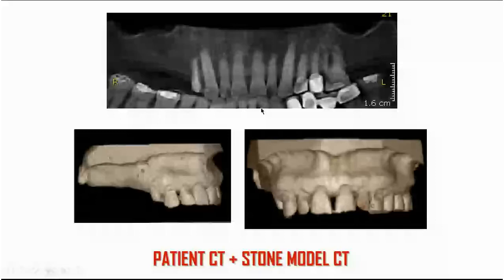And also the easiest way in which we can correlate the prosthetic part of the planning with the imaging findings is if we combine a patient CT where there are a lot of natural teeth inside of the mouth, so we know that we will not have a lot of artifacts, and we will be able to recognize a large number of precise anatomical structures, which will guide us to overlap data in a good quality manner.